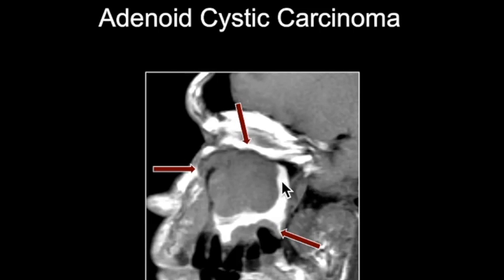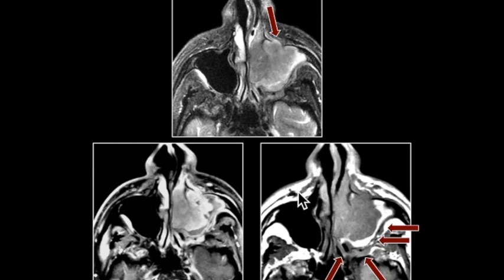Again, looks much like that squamous cell carcinoma. We can see extending anteriorly along V2. We can see the trapped secretions on this T1 weighted image. And we can even see some tumor or something, at least along the alveolar recess of the maxillary sinus. And by the way, a little bit of tumor in the pterygopalatine fossa posteriorly as well.